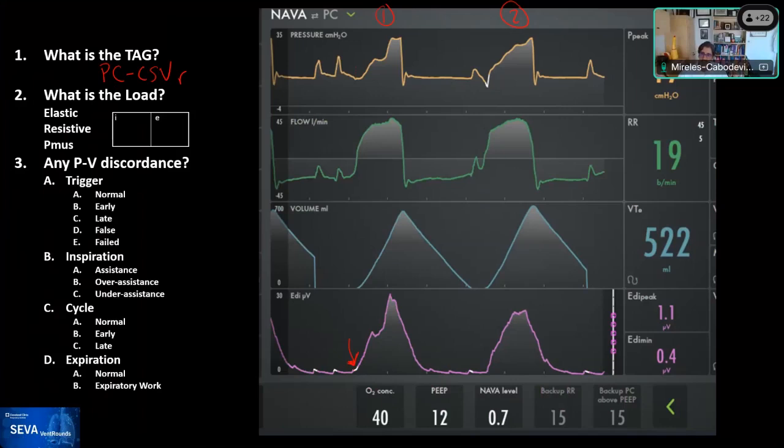And this speaks to the comment that Ariel mentioned regarding how the respiratory muscles activate. Sometimes the upper chest may activate first, starting to drop the pressure, and then followed by the diaphragm activation. So it's more complex than what we're used to, where one follows the other all the time. But when there's disease, there may be these abnormalities.